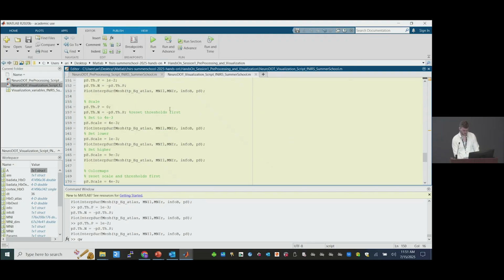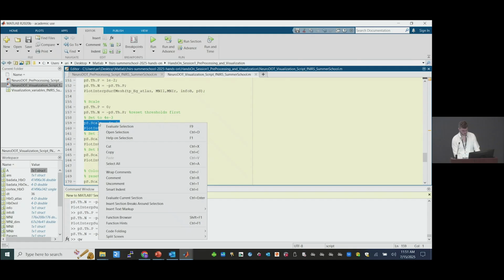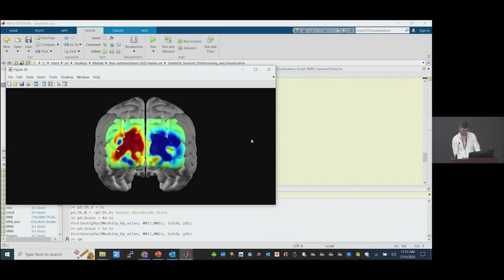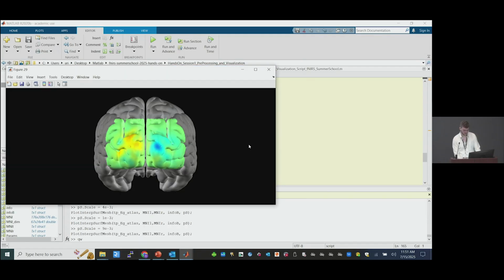We'll play around with the scale here too. It's a little bit easier to visualize with surface-based visualizations like this. So for example, with a starting scale of 4 to the negative 3, we have our standard data. If I were to set the scale lower, as we remember, it gets a little bit more saturated. And then if I set the scale higher, it gets less saturated.